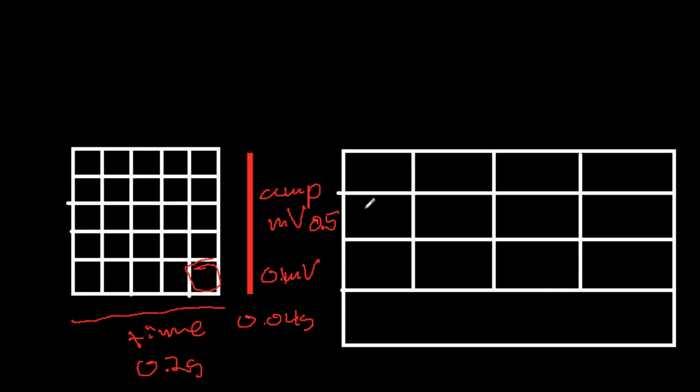All right, and then this graph paper is usually divided. If it's a standard 12 lead ECG, it's going to look something like what we have over here. These leads are most often organized in the following way. With the limb leads over here, this would be limb lead 1, limb lead 2, limb lead 3, and the AVR, AVL, and AVF leads.